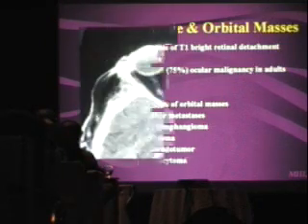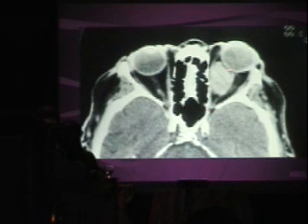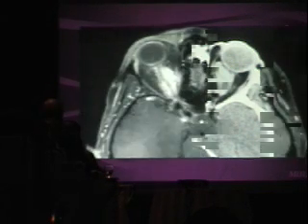All right, other things. This was actually a schwannoma, again, more tubular along the course of this and growing all the way up to the globe.